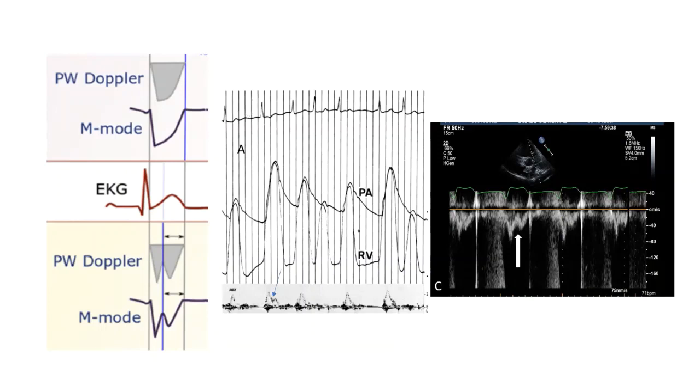Well, the thinking is that in the pulmonary circuit, when there is an increase in impedance downstream, reflected waves may return to the pulmonary valve and to the right ventricle and will cause a premature closure of the valve and an interruption in the flow.